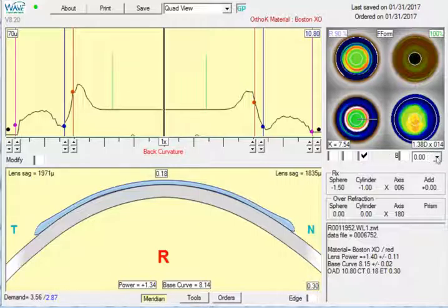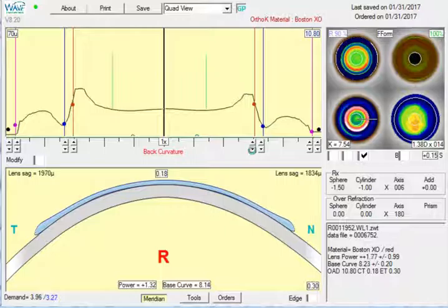And so after adding in the shape factor, usually what we'll want to do is readjust the base curve so that our topo demand is similar to 3.56 again. So we can just go to the red here, and we're going to steepen everything overall.